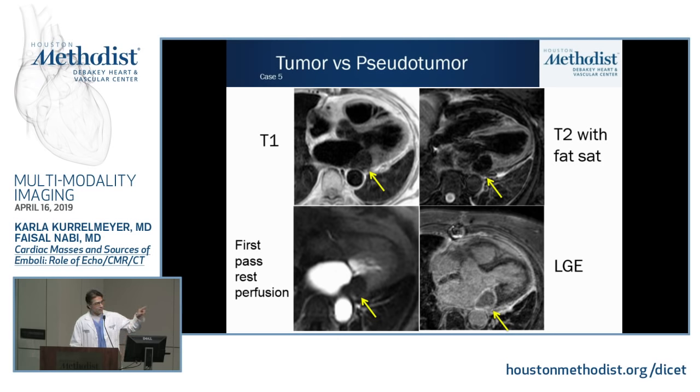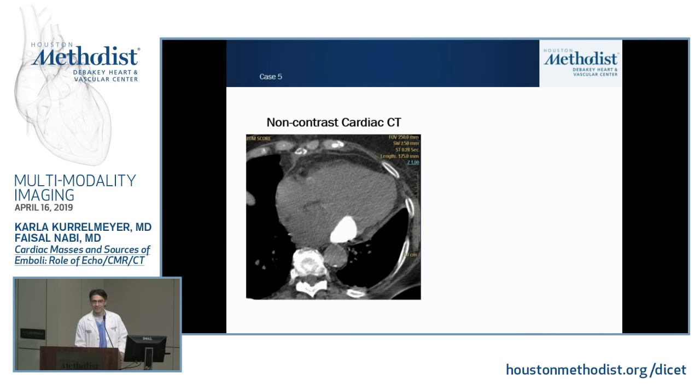And in cases with this very aggressive mitral annular caseation, you often see this rim of fibrosis, the body trying to wall off this calcium that is present. So, we did this for the heck of it. I sent the patient off to Dr. Mamarian. We got a non-contrast CT, and you see this. I'm not joking.